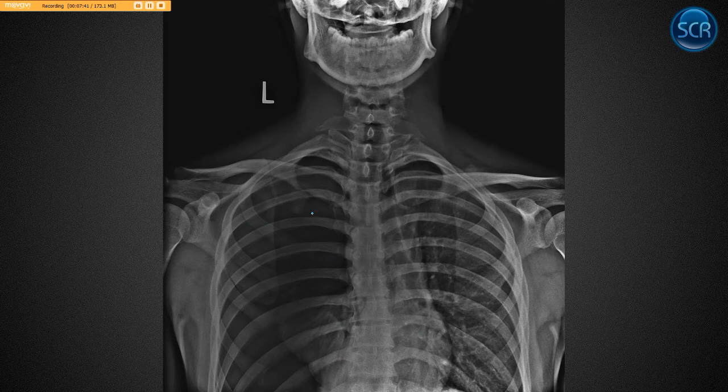Okay, so this happens sometimes, and it causes back pain. Young, healthy men more commonly, and so this is a case of pneumothorax. This is very obvious. So this is as obvious as it gets. No one should miss this. Okay, I wouldn't even put this on a board.